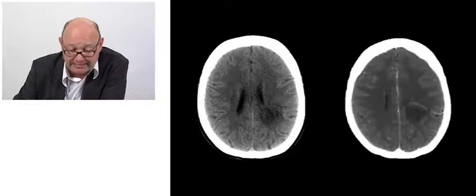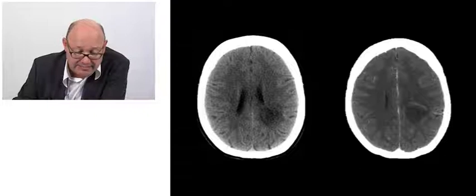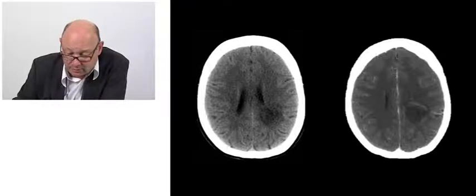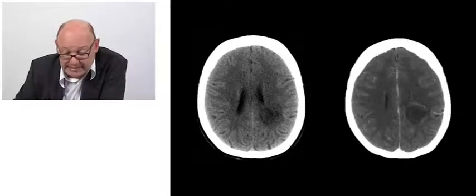Before I end, I would like to discuss with you shortly pattern analysis of contrast enhancement. This is a patient who presented with some symptoms. You see on the unenhanced CT a hypodense mass lesion. The colleagues of the neurology, they really were sure that this patient had a meningioma. Contrast was administered, so we did a CT scan after contrast injection, and we see there is some enhancement in the periphery of this lesion.